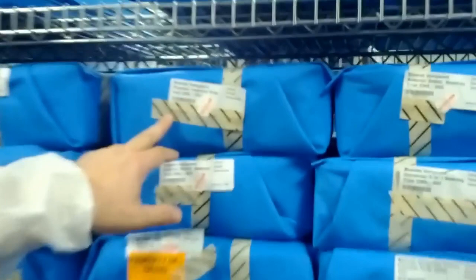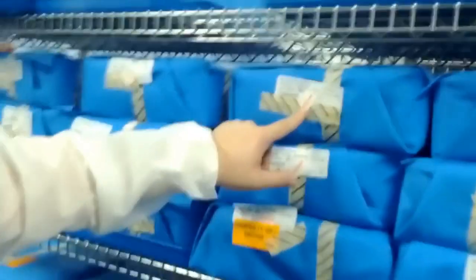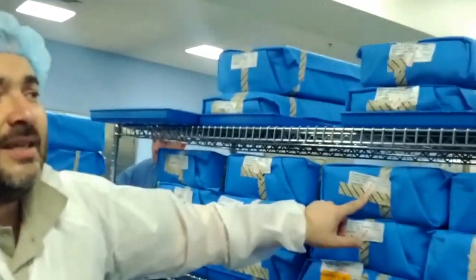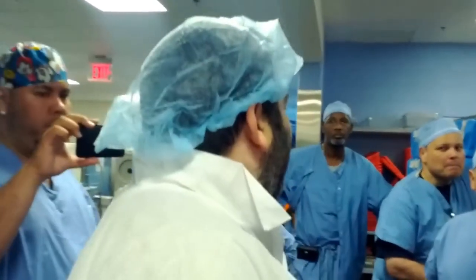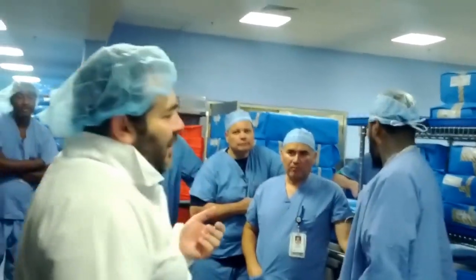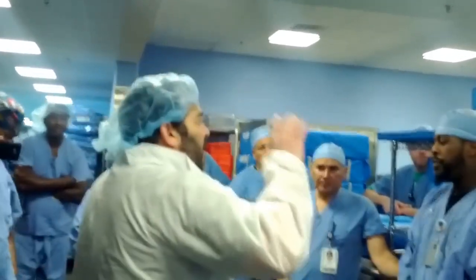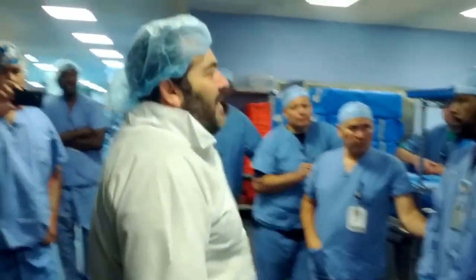If we look at the packages over here, we can see the chemical indicator tape has turned a color. That particular color indicates that it has been run through the sterilization cycle. This little tag right over here bears a Julian date. A Julian date tells us how long it's been since the first day of January. They keep track of inventory and sterility this way. The sterility of a package is not usually guaranteed by time, though some do have an expiration date. Package sterility is event-based, meaning something happens to a package.